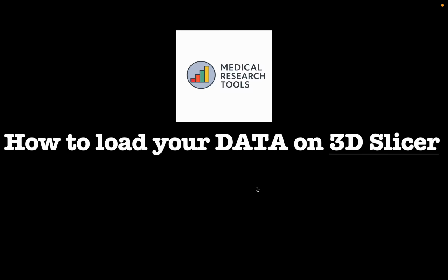Hello everyone, welcome to the third video in this series. I am teaching you how to work with 3D Slicer and how to create 3D models out of your medical imaging data. Before we start working in 3D Slicer, we need some imaging data.